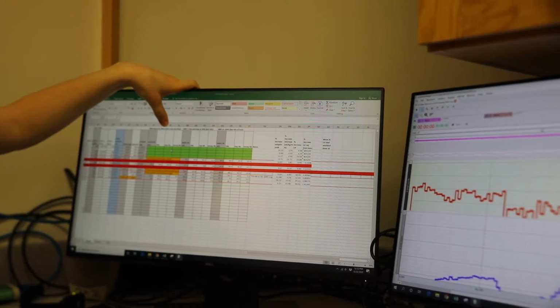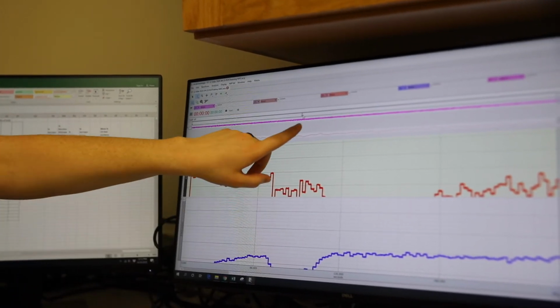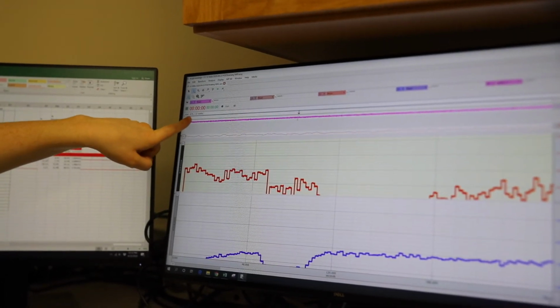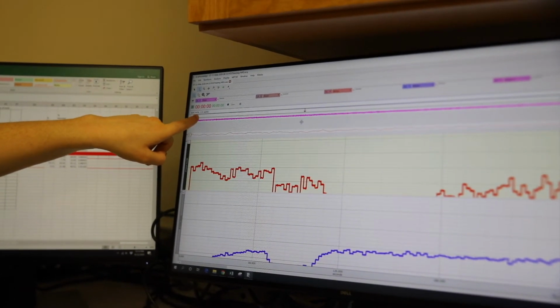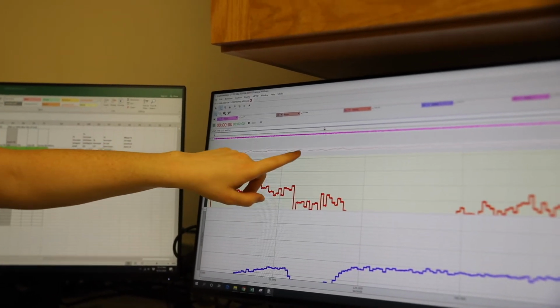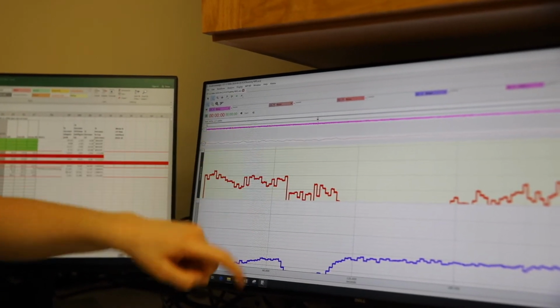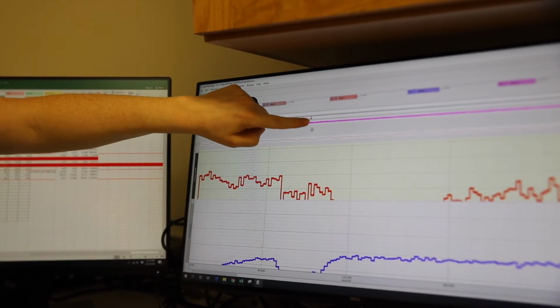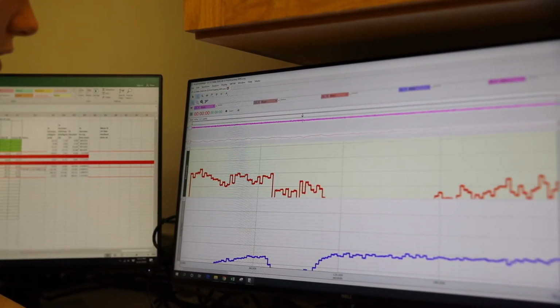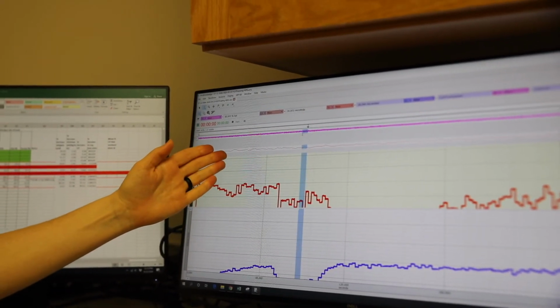So for this specific study, we want to analyze NIRS for 60 seconds before the subject did any type of warm-up. So to do that, we're going to come over here. We already scrolled to the very beginning of recording data. This first point, if you click on it, you can see that it's labeled as the start of their 44% warm-up, or 110 watts. And so you have to click the cursor so that this line, when it shows up, is right in line with the point of the triangle. So right there.